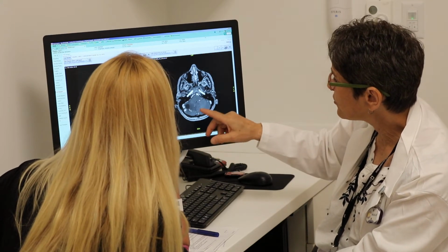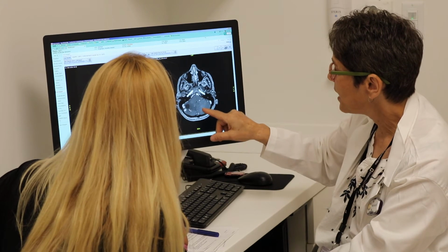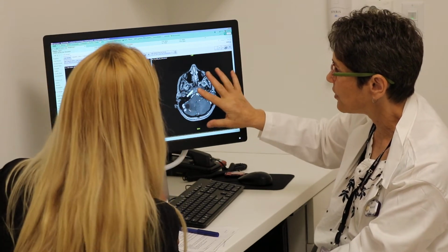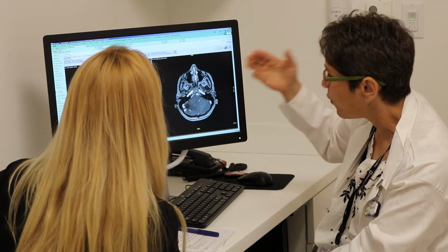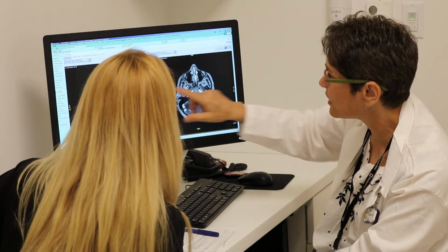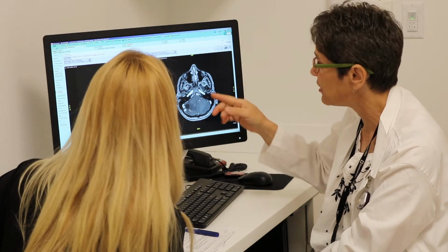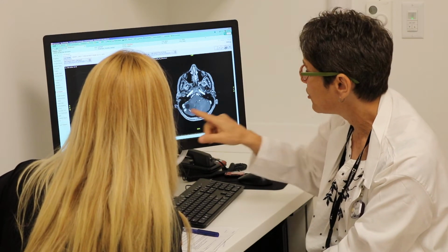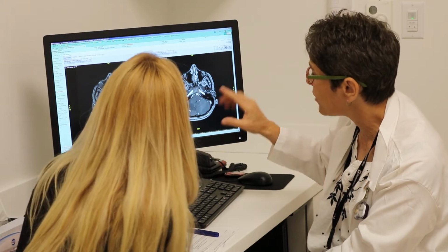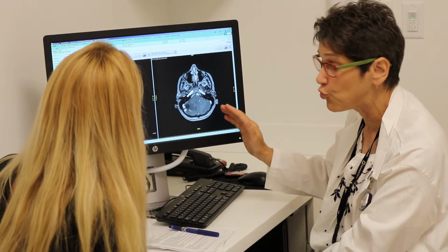To be very honest with you, I said this was brighter here. The whole contrast phase on the one you have today is brighter. Where they caught the contrast, where it came in, everything's brighter. The nares are always the dead giveaway for contrast phase, and see how bright they are here. Everything is brighter on this phase, and that has nothing to do with the tumors or uptake.